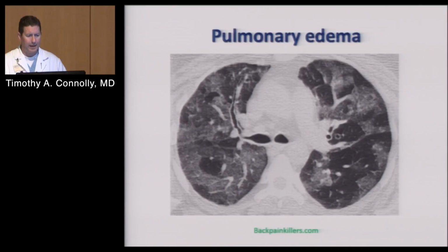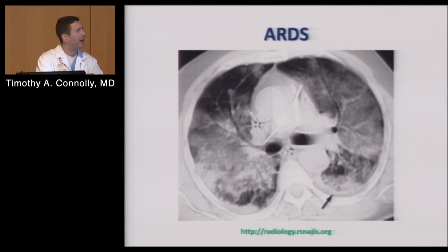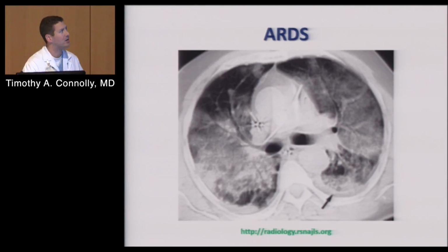Pulmonary edema, again, I want to just emphasize the ground glass nature, classic cardiogenic pulmonary edema. ARDS is a little more robust generally on CT scan. And ARDS as a clinical entity, we call it having baby lungs, and the whole reason you use lung protective ventilation is they've got normal lung right here. And if you end up putting them on normal mechanical ventilation, you're going to blow that normal lung out. This stuff isn't working well, but it's always that kind of mosaic pattern where there's some good next to some bad. It's bad zoning.